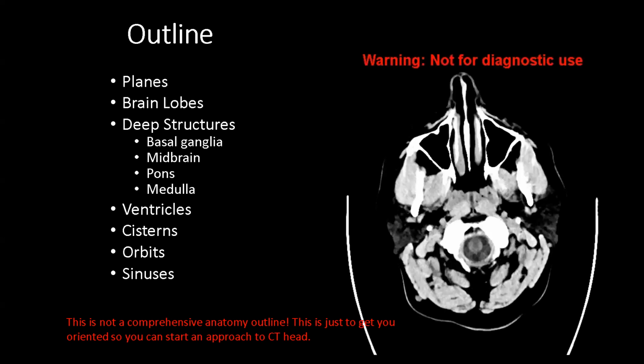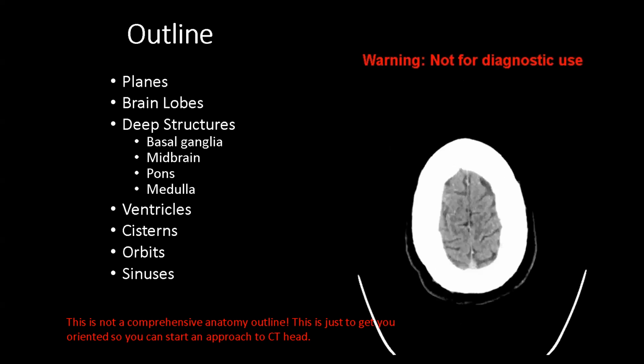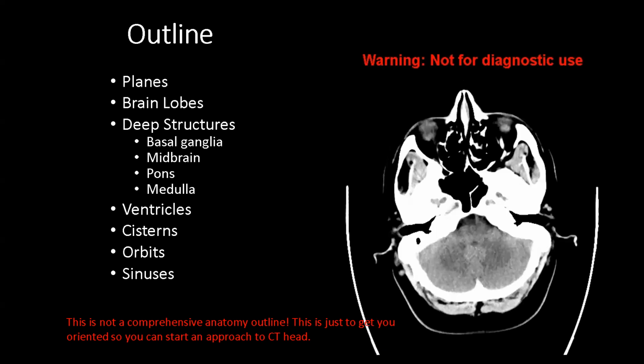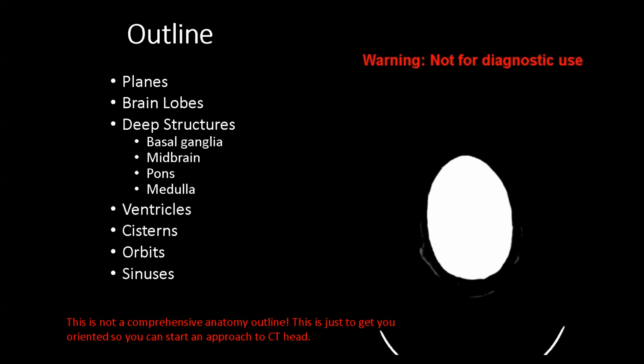As we go through the presentation, I'll have the axial images of a CT head coming up on the right side of the screen, and I'll be able to show where the structures are as they are labeled on the left side of the screen.